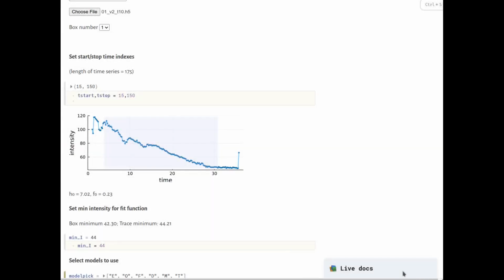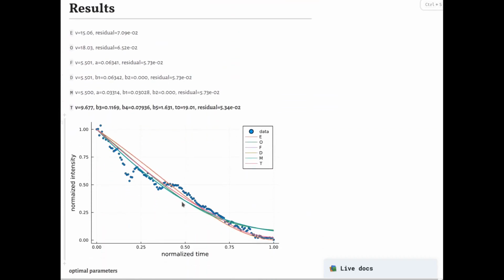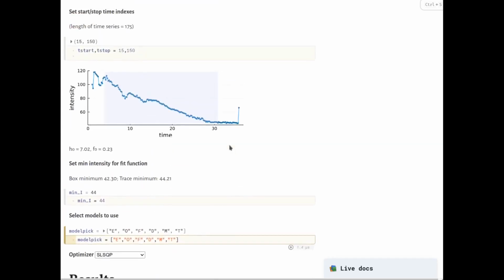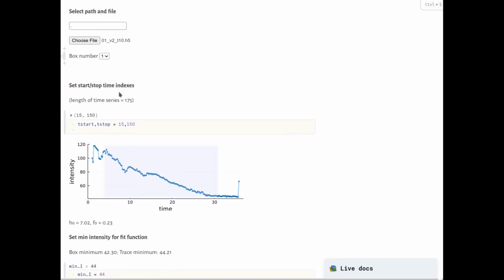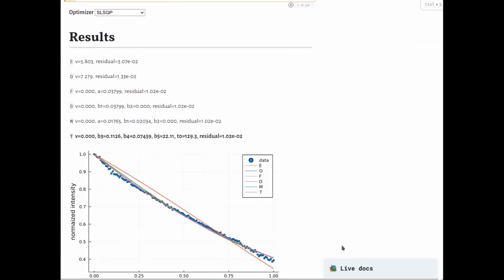Tear film breakup is a complicated physical and chemical process that is not well understood. Once we've captured time series of fluorescent intensity over a region of interest, we fit PDE and ODE mathematical models of TBU to the data. By using a reactive Pluto notebook, we have been able to explore the consequences of modeling decisions in real time, and we are now preparing to process the entire data set automatically. This will be an unprecedented new resource for understanding human tear films.